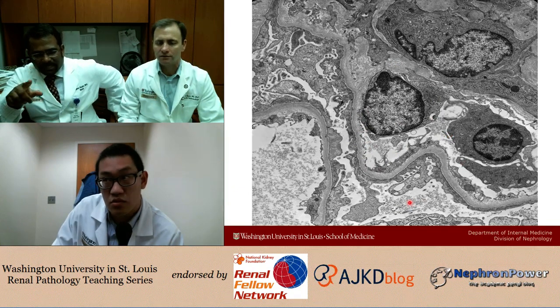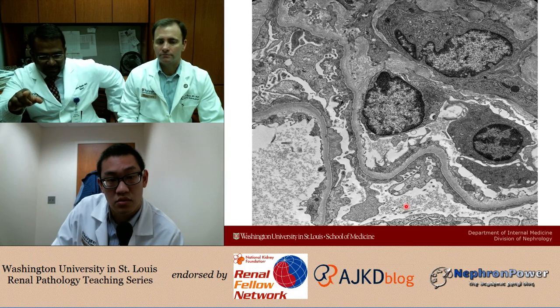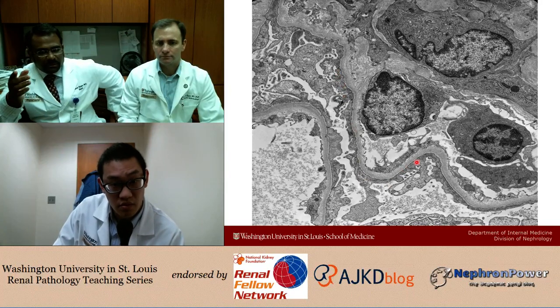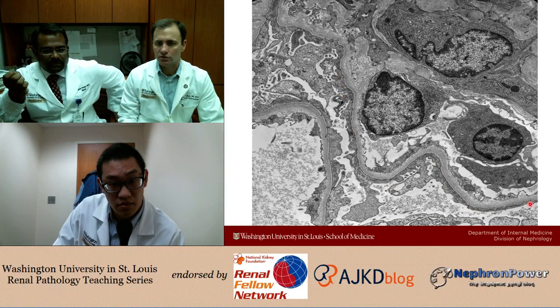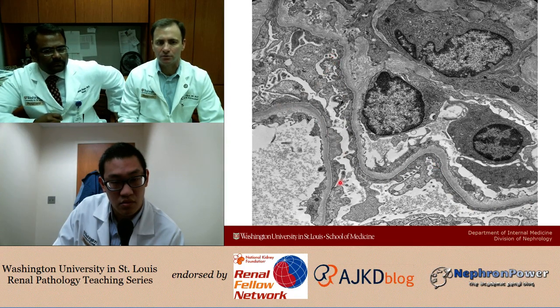Then we have the basement membrane. Then we have the podocytes. But there, I don't see the foot processes. The foot processes are fully effaced. I don't see it throughout if we follow it through. Very good. They're just completely fused, completely effaced here, where you cannot make out individual foot processes in this particular biopsy. And up here, just for completeness' sake, this is the mesangium and a mesangial cell nucleus.